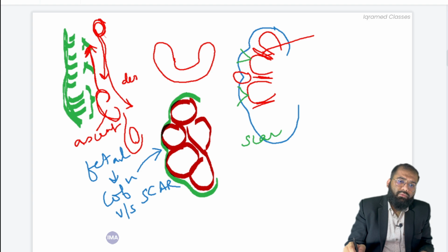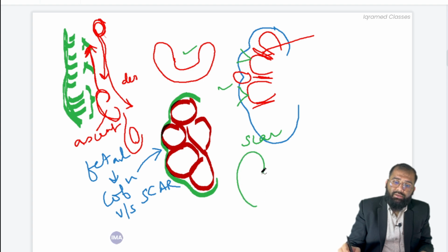So we saw one of the important embryological bases, where you saw lobulated kidney. Then we saw horseshoe kidney. Similarly, there can be an entity, suppose this is the kidney on the right side, and the left kidney might be absent, and the left kidney might be there on the right and might be fused with the right side.